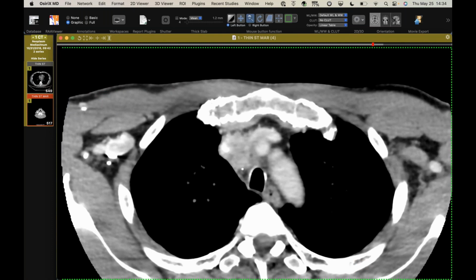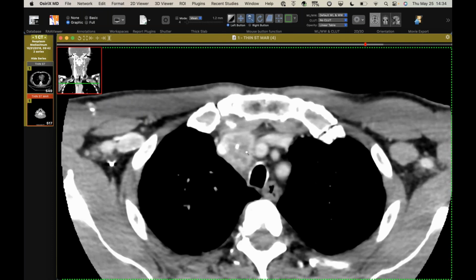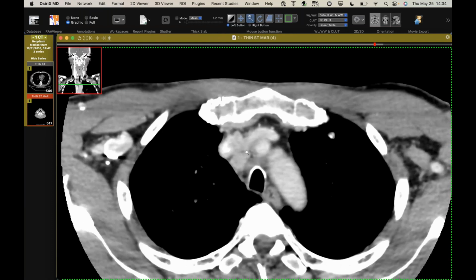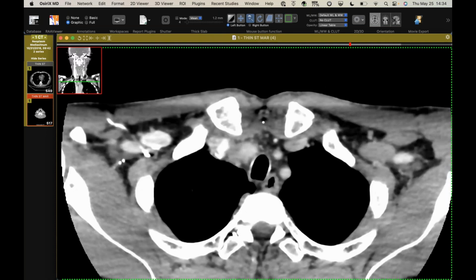I've seen true ectopic thyroid just a handful of times. Often you can connect these little what look like masses to the thyroid gland. And then I think David's shown one, and I've seen a couple of cases with truly a mediastinal mass, but never a thyroid cancer. Yeah. And there's nothing in the gland to suggest it's a met.